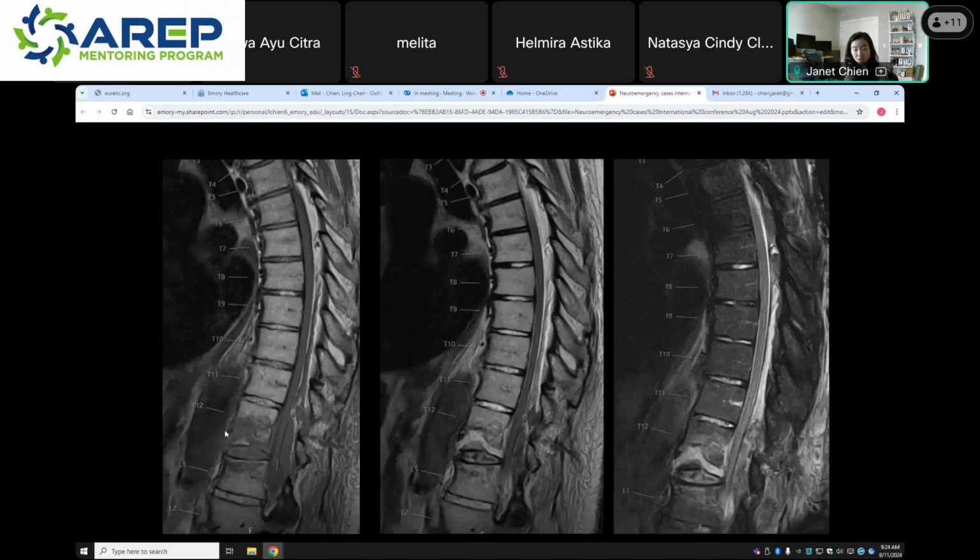You can see the T12 fracture, T1 hypointense. There's also actually an L1 superior vertebral body fracture here. And so on T1, fat should be nice and bright and homogeneous. So this is your normal dorsal epidural fat up here in the mid-thoracic spine. And as you come down, it becomes very heterogeneous and dirty because all of this is hemorrhage in the dorsal epidural fat.